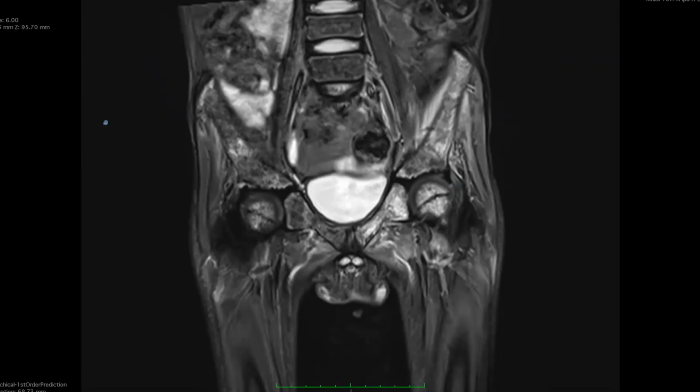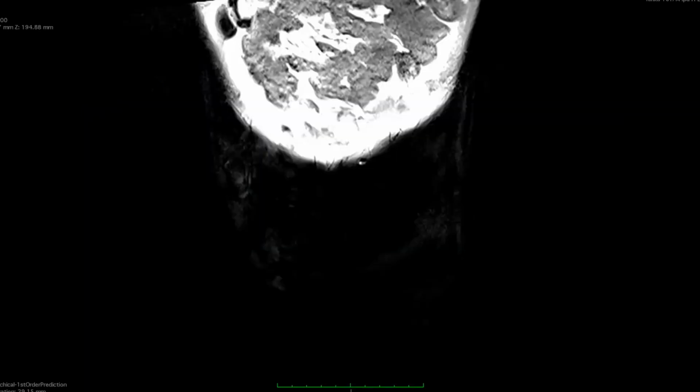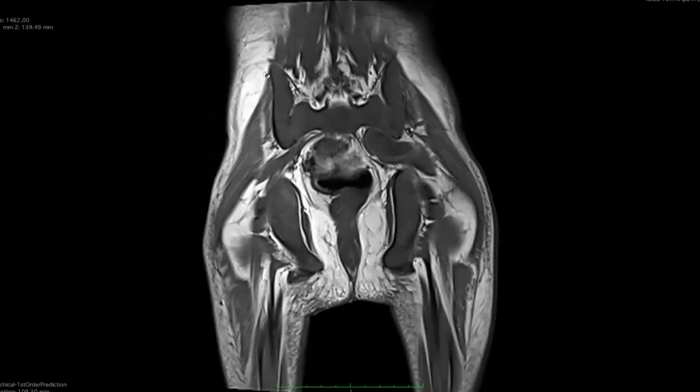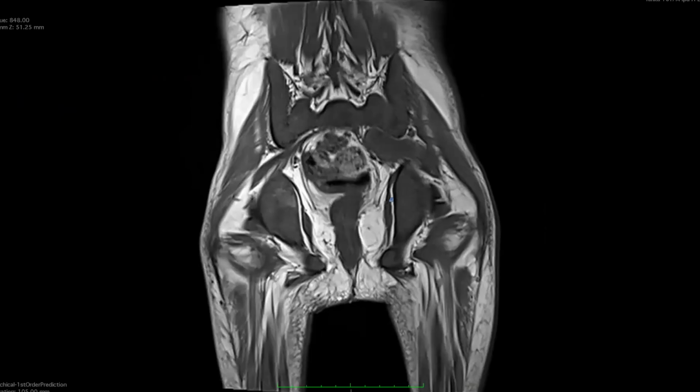All right. So I'm going to share the T1 weighted sequence. Just leave the control for a minute. Okay. You can scroll. I have to click it once. Yeah, I can scroll.